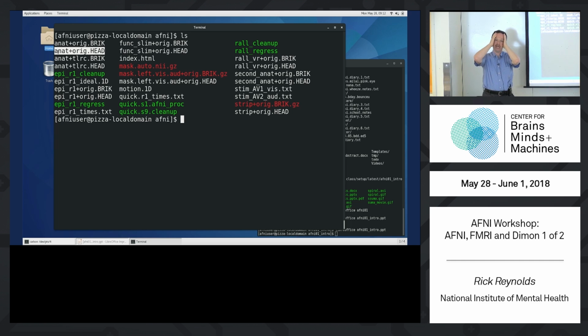That means you've rotated the brain so that there's like a mid-plane cut in the middle, and the AC-PC line is right in the center, and the anterior commissure would actually be at coordinate 0, 0, 0. That would be the AC-PC step, but we don't do that anymore, so you won't see those files often. And then the other type is TLRC.